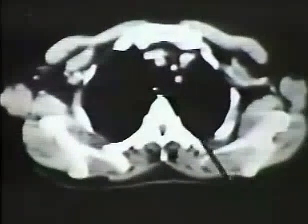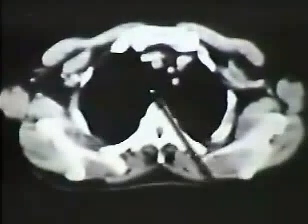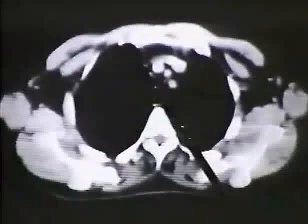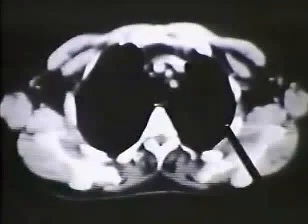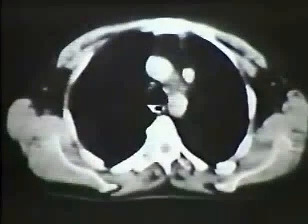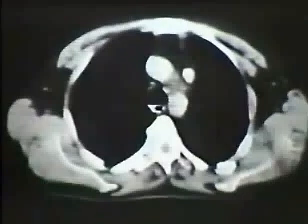Well, we turn to CT scanning, of course, to evaluate the mediastinum. If you look up fairly high in the mediastinum, we see our 3 arteries, again, and we see 2 veins. Well, that looks perfectly normal so far. Let's look at the next cut. What's happening here? The right brachiocephalic vein seems to be joining the left instead of the other. And if we look at this a little bit further down in the mediastinum, at the level of the aortic arch, what do we see? We see a left superior vena cava.